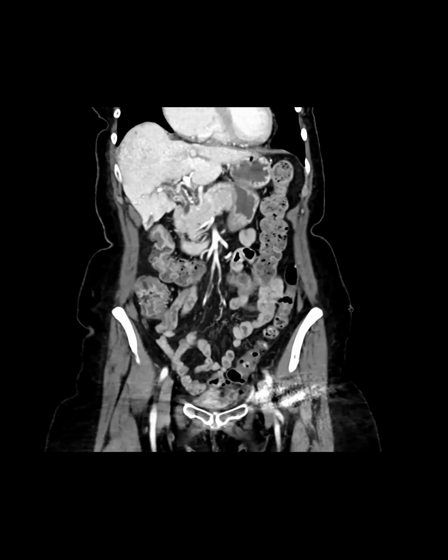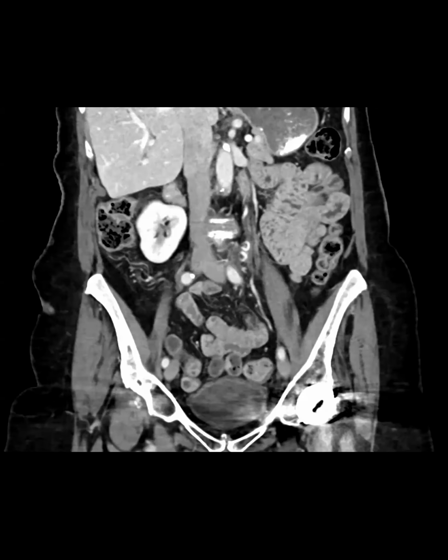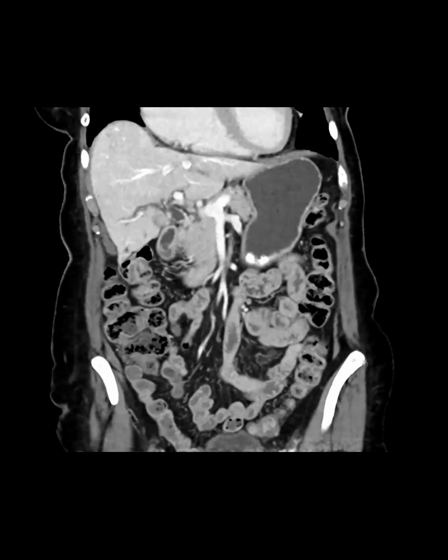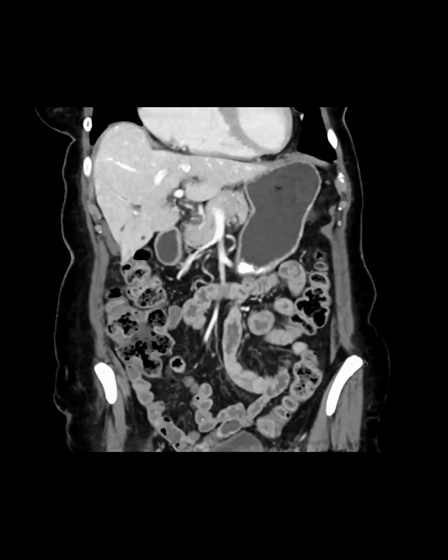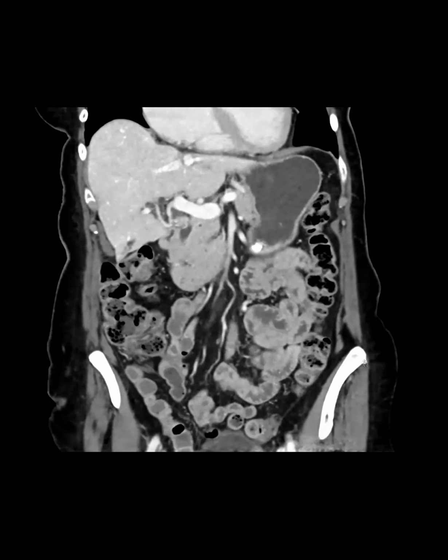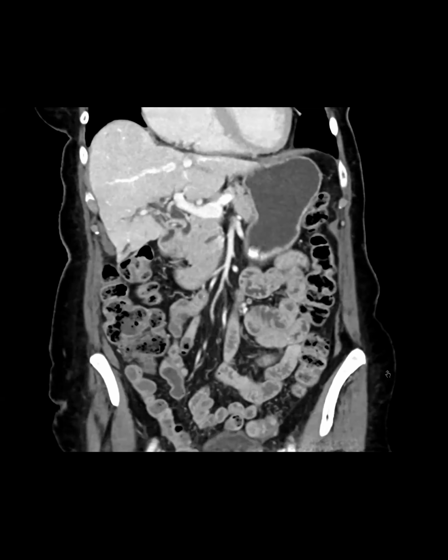Anyways, we see this in the liver again. And then she came back for follow-up. We said no evidence of recurrence. And then we see this duct. Is it like beaded? Yeah, it's coming and going. So we just remarked on the duct. And then the CBD is also undulating and dilated.